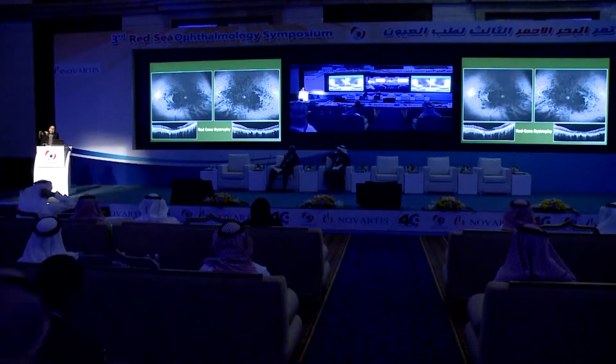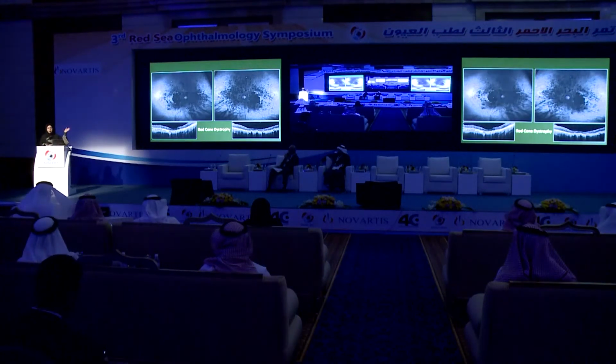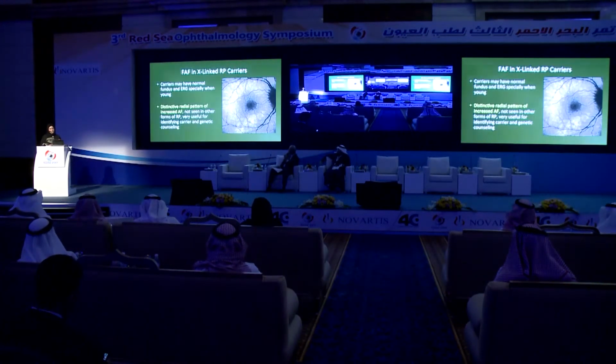But notice that you have the very dark area corresponding to the total atrophy of the retinal pigment epithelium and the photoreceptors, but then again you have a ring that also shows that it's not just the atrophic area, but this whole area within the ring that is quite abnormal. Here's the second eye of that same patient. In rod cone dystrophy, the same thing happens. You have, again, major losses of the retinal pigment epithelium and photoreceptors in the center. And so on autofluorescence, you can immediately tell how much damage there is and the dysfunction of the patient in a very non-invasive manner.